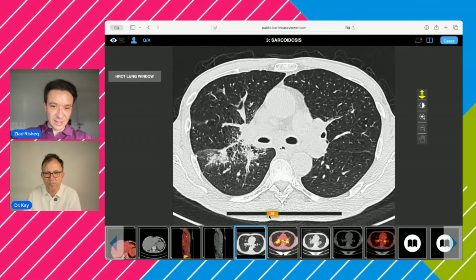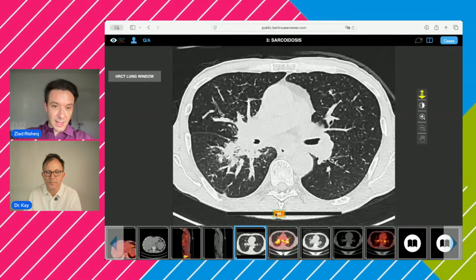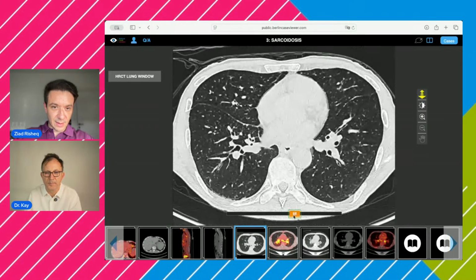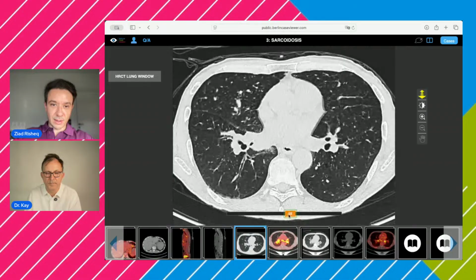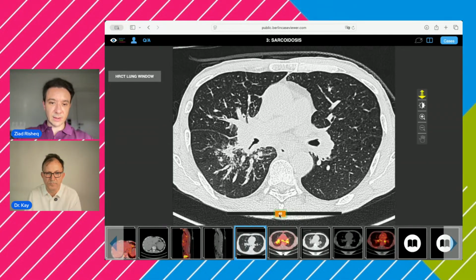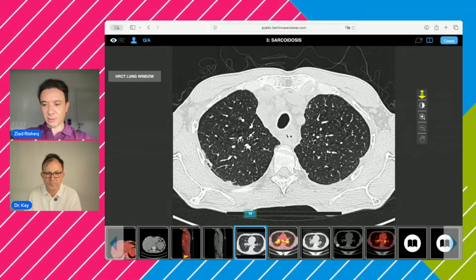And you can see tiny pulmonary nodules adjacent to this consolidation. And here you can see there is fissural thickening and a bit of nodularity, especially here. You can see that there is thickening. So I like these cases because to me they are straightforward. So how do we describe? We didn't look at the bone.